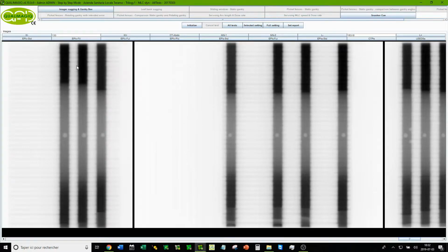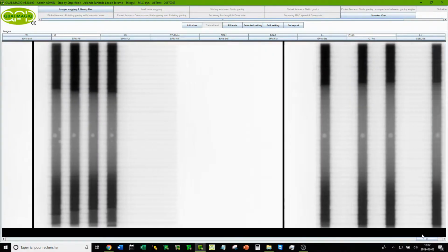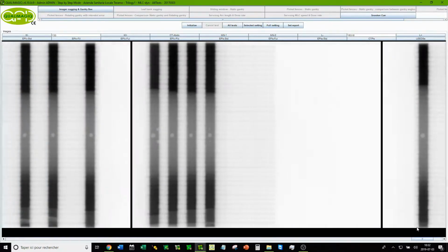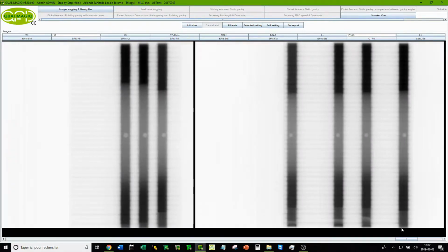Next, there is a sequence for the gantry and for the multi-leaf at maximum speed. When the synchronization between gantry and the multi-leaf collimator is in accordance, the central ball of our ISO test object is in the middle of the radiation slit. In this example, 4 different sequences were made of the multi-leaf and the gantry. This test of gantry and MLC precision is very pertinent, with the advantage of being very quick, so it can be performed on a daily basis.